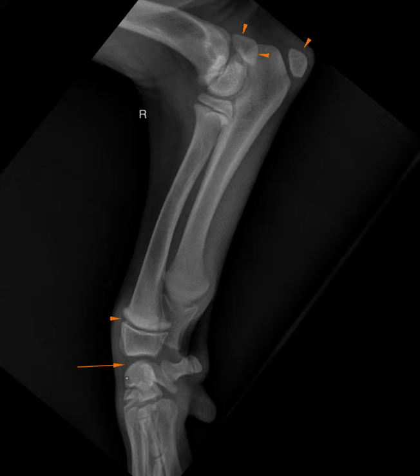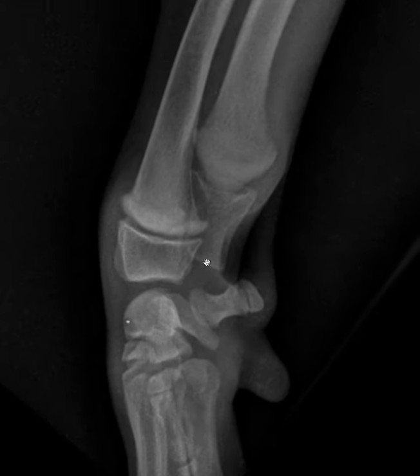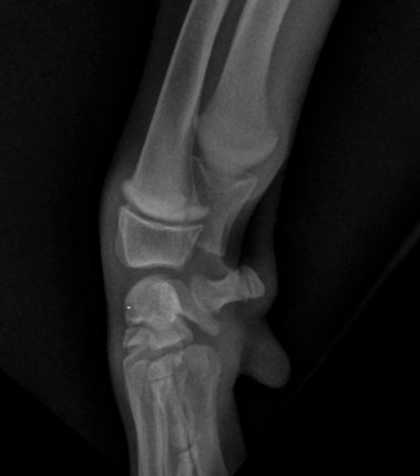So when we look at the physis, what I deviate from in my ABCDs is I look at the physis with some additional criteria in my mind. I said for the long bones, I'm looking at cortex, medulla, periosteal surface, endosteal surface. When I look at the physis, I get right into all those classic radiology words, okay? So what words am I talking about? Size. I'm interested in how wide is the physis.